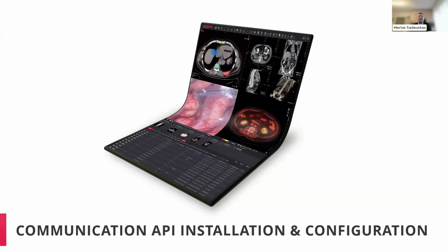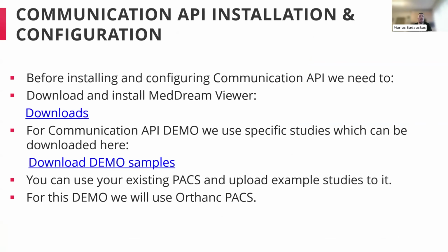Okay, now let's go to this Communication API installation and configuration part. So in principle, there are three things you need to do before installing and configuring the Communication API. The first thing is to download and install the MedDream Viewer. I hope you know where to find it. On our website, you can find the download section, and you can download and install the MedDream Viewer on Windows, on Docker, on Linux, depending on how you would like.